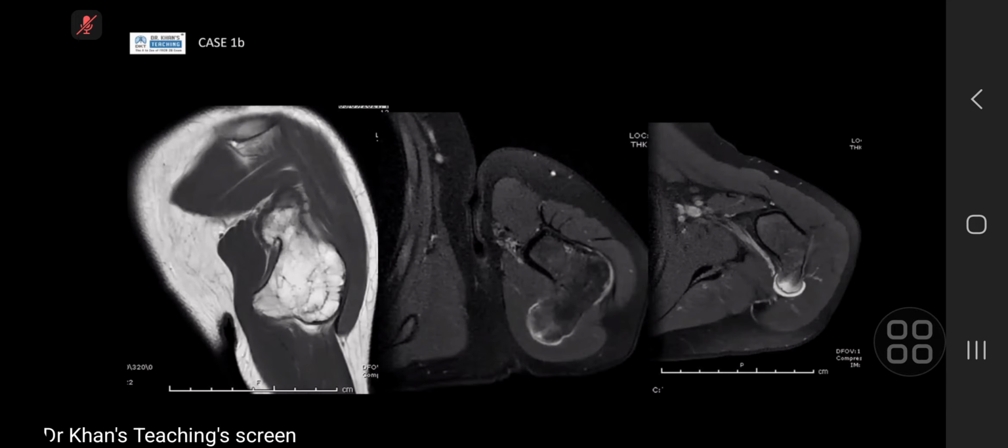Okay, great. So if I show you the MR here, and you correctly identified this as an osteochondroma, you can see that medullary continuity within the lesion. You talked a little bit about the cartilage cap, and yeah, you're right. So you're looking for anything over about 1.5 centimeters in adults. It varies in children. I think it's more of a clinical decision, you'd be guided a little bit clinically. Is there anything that you wanted to mention on the MR?